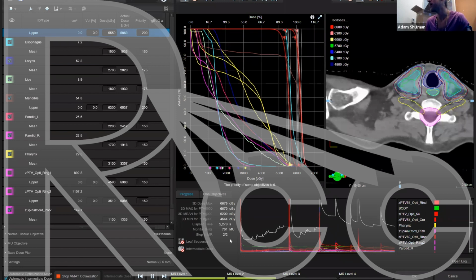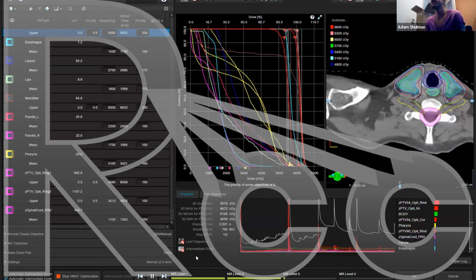So again, keep that in mind, have that discussion with your doctors. There are places that intentionally keep the mandible extra cool, spend extra focus on that optimization process. But I will leave those exact values of what's desired clinically to your radiation oncologist, or refer you to different literature out there that has those different studies with different dose levels. Okay, we're in step 3.